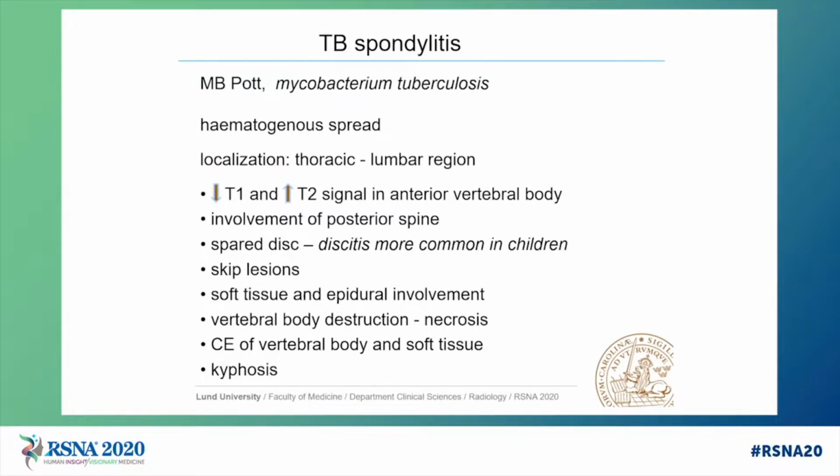Most commonly, it's located in the thoracic lumbar region. In children, you might see discitis. Otherwise, usually you would have a spared disc and you might see skipped lesions.